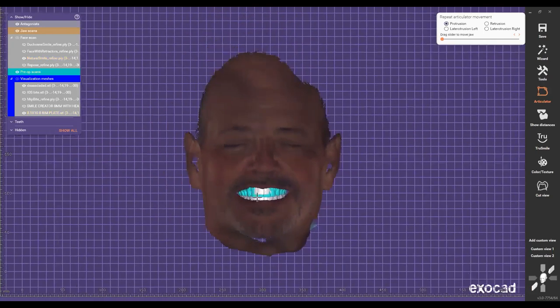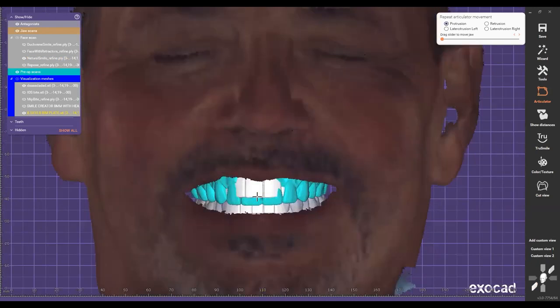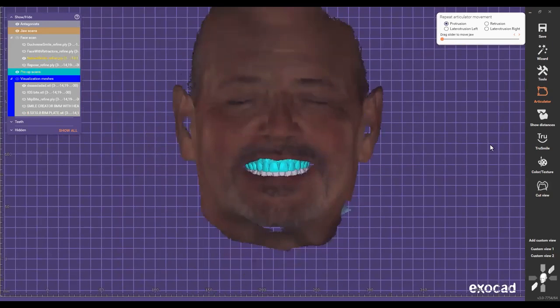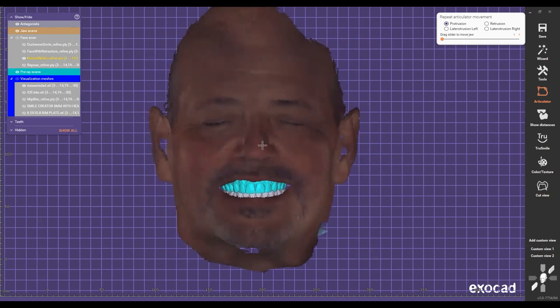So that means that it's going to be more 3D visually driven workflows, right? Using the faces, because remember, I have to import the faces manually from the Remove mesh. There's nothing on Exocad on the DB project to have faces. So, you know, big things are coming, guys. So that way Exocad will be much better for this type of cases.